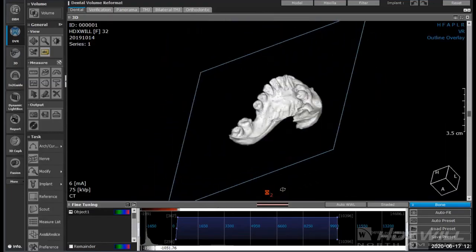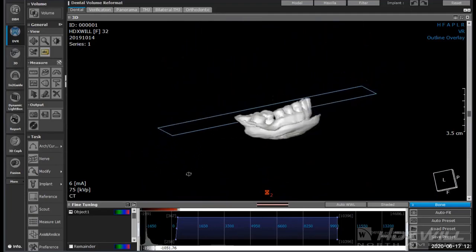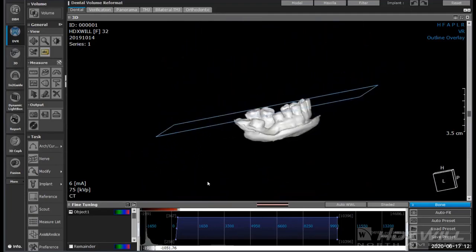Now we have the stone model, and we can work from that stone model to build an STL from it. All we have to do through the software is a couple of moves to grow that, fill it into place, and then we can turn that into an STL.